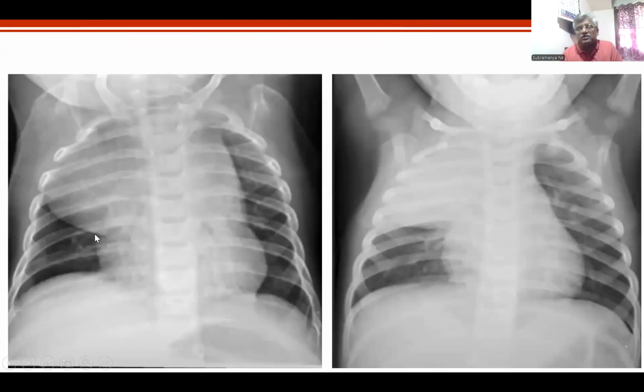Now, what is the difference between these two X-rays? Now I've come to a high level of application. X-ray 1 and 2, what is the difference? The point which I wanted you to look at is that there is increased radio density in film number 2. Do you agree? More dense. Now, from tomorrow, can you all have in your eyes the radio density of a thymus?